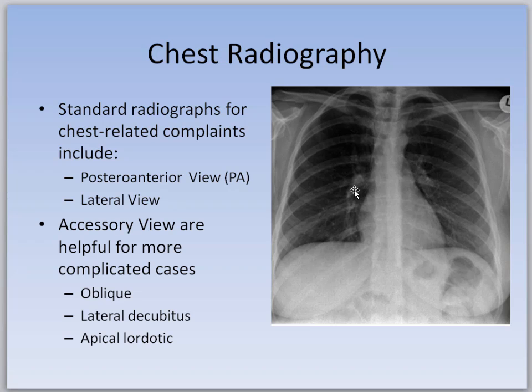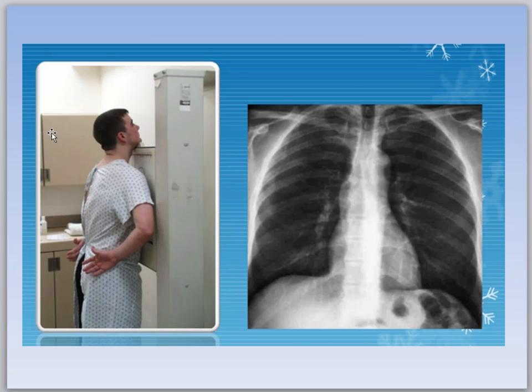So you'll learn more about that though. Here's how it's taken, what you learn how to do. It's not taken looking at the x-ray tube, it's taken away from it. You spread your scapula out of the way, and then you get a beautiful image like this.